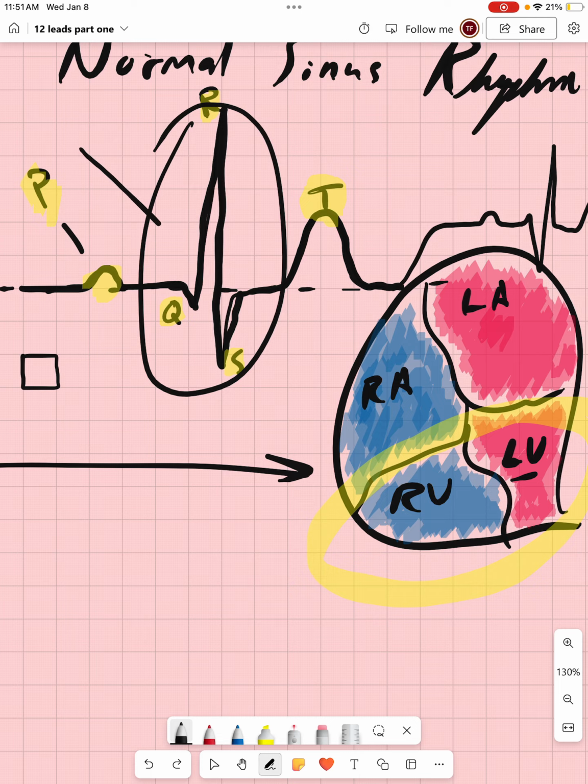It is going to take place in this spot, in our QRS. And what I mean is this same time frame. So when our ventricles are depolarizing, at that same time our atria is repolarizing, but we're not visually seeing what that looks like because of how much space the QRS complex takes up.